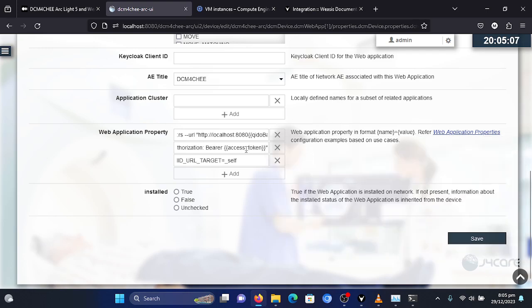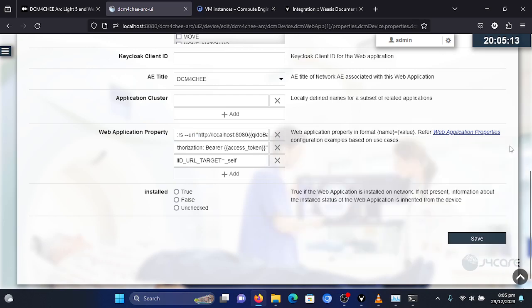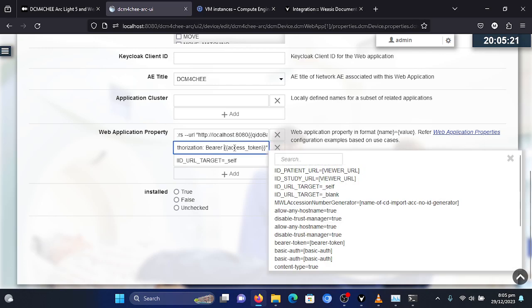So you have to set this up for yourself. Make sure the domain and your SSL are valid, and you will be good. We have to do the same thing for this other URL here. Okay, so remove the S from there.